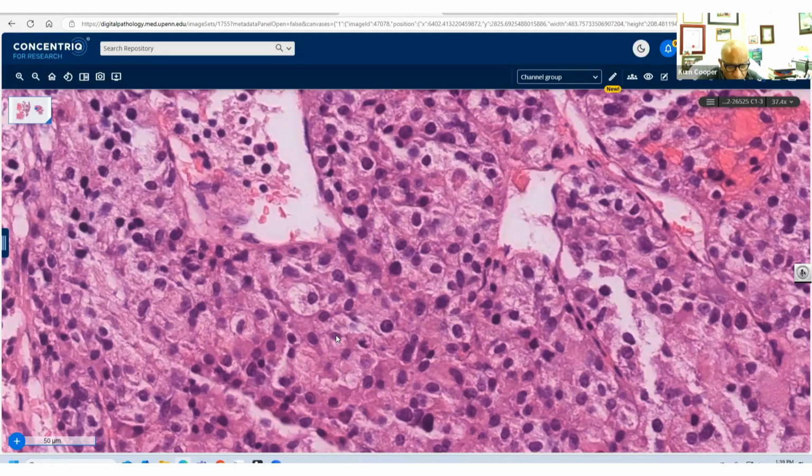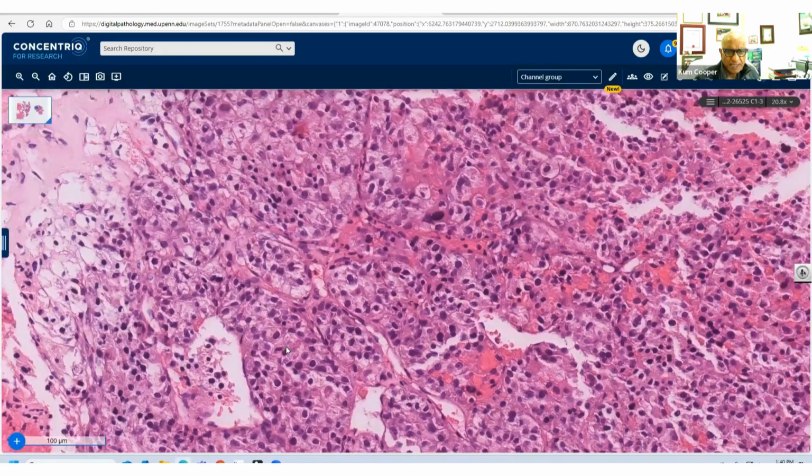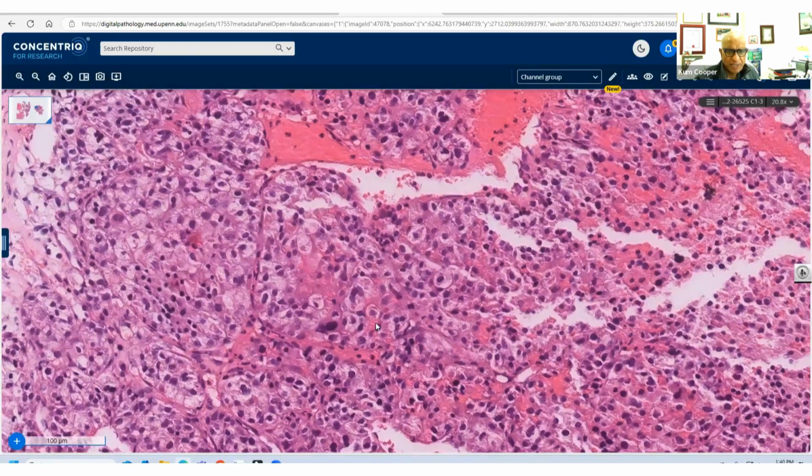And then, of course, for your PEComa, you're going to resort to your melanocytic markers, which we talked about earlier, in order to confirm that. A small subset of PEComas do have TFE3 rearrangement. And some people claim that they had less muscle, I think it was, in the early days, and they tend to be a little more clear. But the majority of PEComas have TSC1 or TSC2 mutations. So that's the other way of doing it. Any questions or comments? Nice case, some pleomorphism here as well.